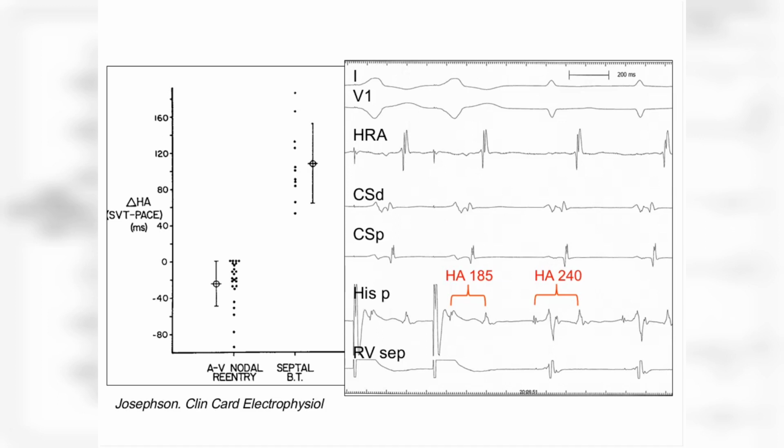Absolutely. I mean, obviously, the activation sequence is very important. There's no question about that. But that is very important, for example, in this case, because it is clearly an eccentric sequence. But sometimes this is not the case. Or sometimes it's hard to catheterize the coronary sinus.